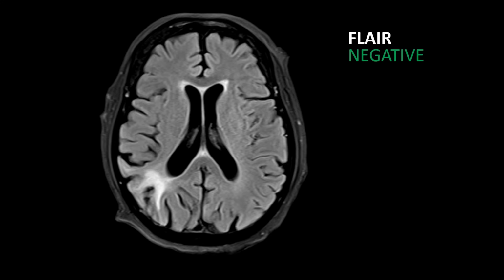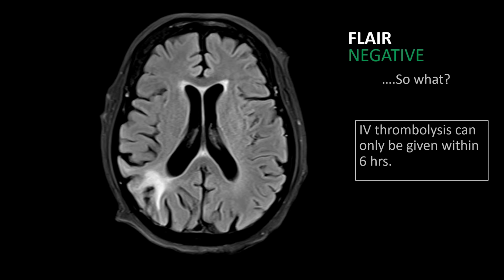Now it's a FLAIR negative infarct. So what? The importance of this is that IV thrombolysis, which is a therapy for stroke and which can be very crucial in some patients, can only be given if the onset of stroke is within 6 hours.